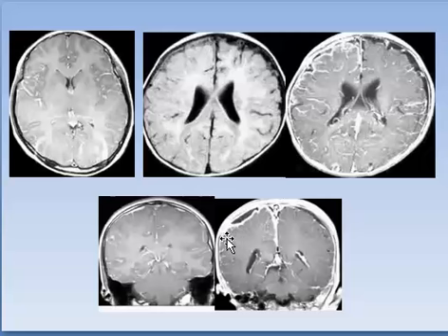Here is empyema again, the start of meningitis seen as hyperemia, and here the start of the empyema, and here the final appearance. There is a definite collection enclosed in these displaced meninges with definite hyperemia and enhancement of the meninges around.